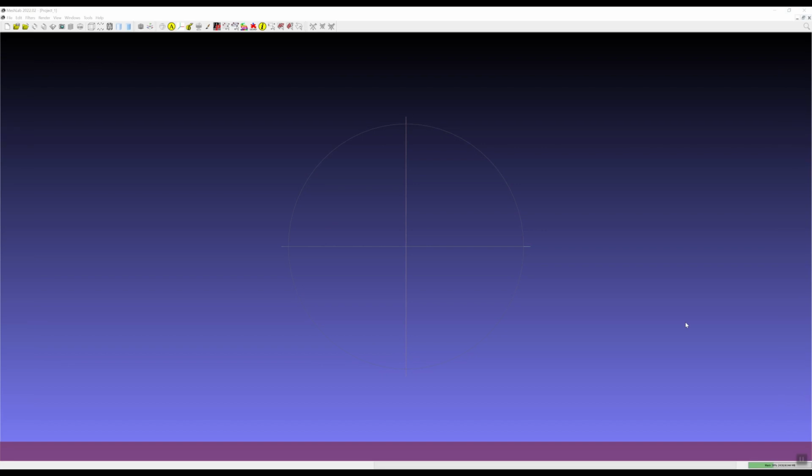I'm going to show you a few different things that you can do once you get your models exported out of your CT software. Specifically, I'm going to go through some tools in Meshlab, and then I'll show you some tools in Blender, and how you can also just bypass all of that if you want and just use the Sketchfab editor to make your models pretty.